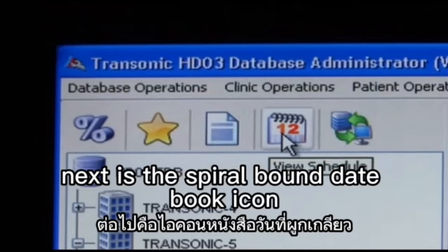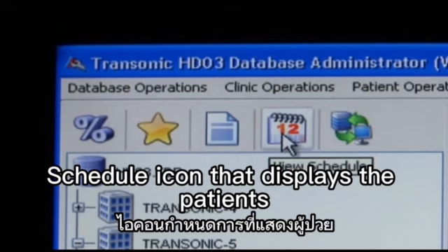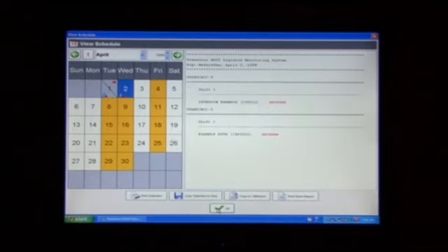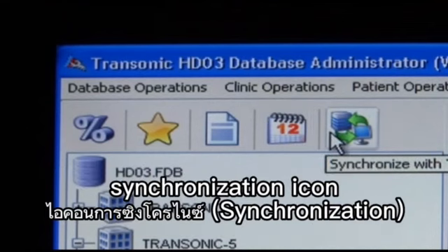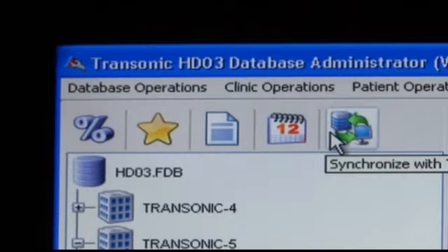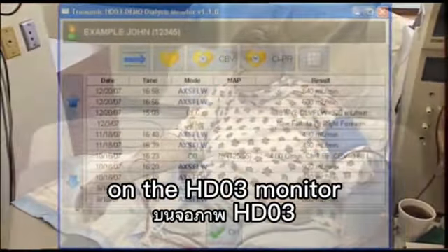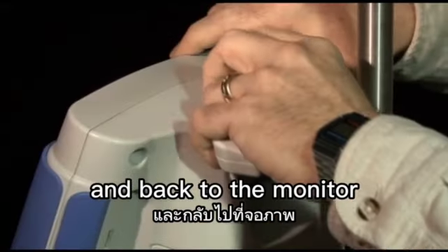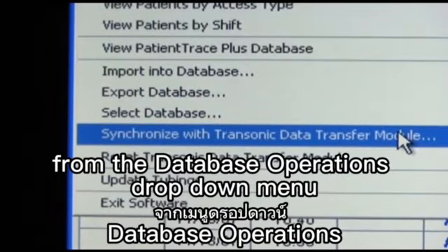Next is the spiral-bound datebook icon. This is the View Schedule icon that displays the patient scheduled to be tested for a particular month. Finally, the icon on the far right is the very important synchronization icon. This is how you transfer the data gathered at the hemodialysis clinics on the HDO3 monitor to the administrator database and back to the monitor. You can also perform a sync from the Database Operations drop-down menu.